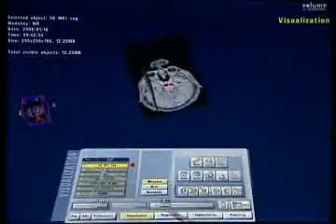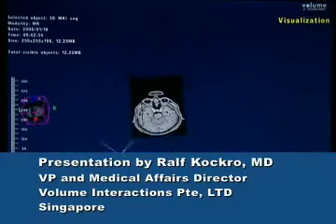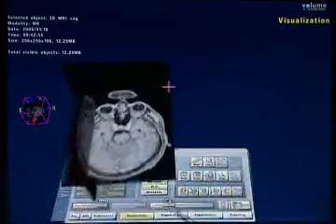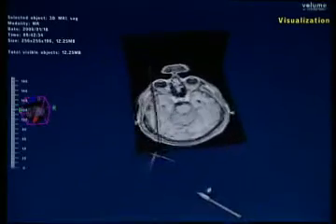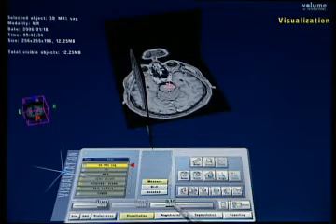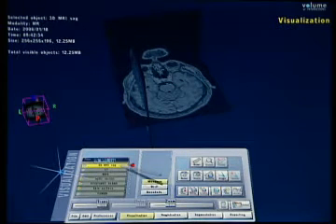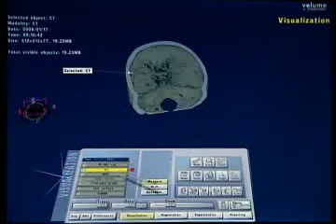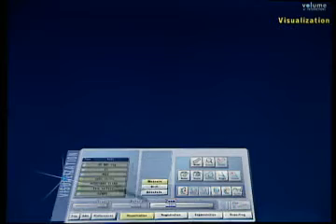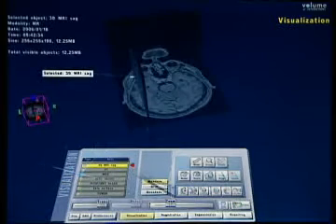As you can see, this is the gradient echo contrast enhanced MRI, which I've activated. Just to run you through the functions a little bit of the tool rack. All my different imaging modalities, I'm having them all lined up on the side, and through the presentation you will see me activating or deactivating different imaging modalities.